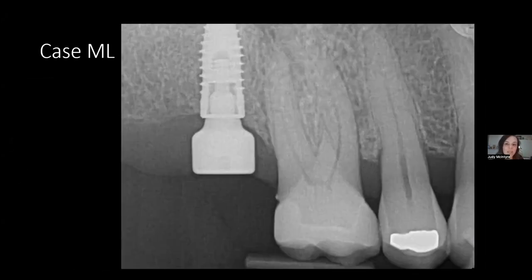So this case is pretty exciting because we've been talking about cracks and fractures, and this tooth does not have a crack, but I'm sharing it for another reason. So let's look at the 2D image. So possibly we have a periapical lucency on this upper first molar. And maybe if we were to squint a little bit more, we could find some other findings as well on this 2D image. And definitely there's an angular defect here, right?